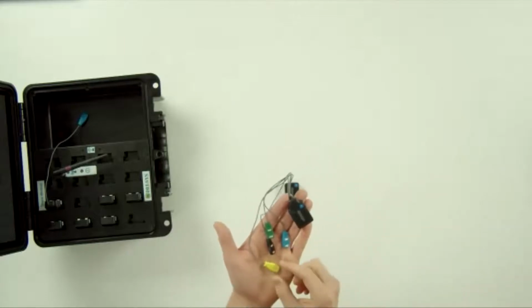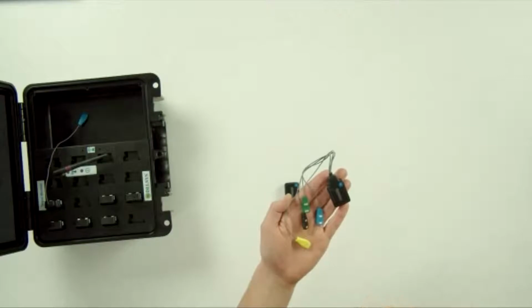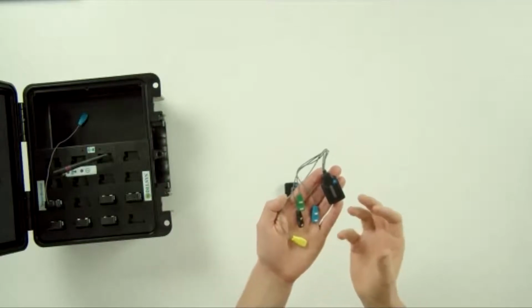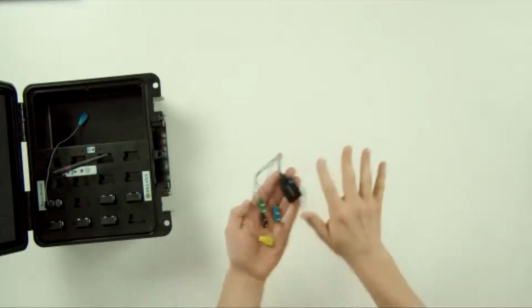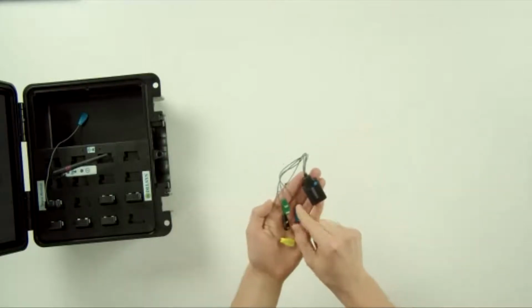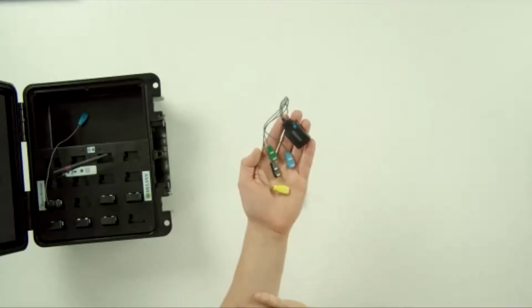Back in the summer, Delsys and Qualisys did a demonstration showing how we could look at tracking facial movements and facial EMG. Today's example, which Niels just gave you a quick tease of, is tracking of the fingers and the hand, and at the same time looking at intrinsic hand muscles and wrist muscles by studying the forearm muscles.